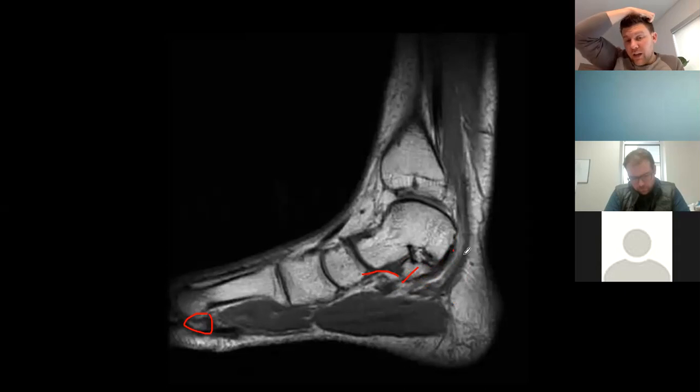Okay. So you're going to say that it's hyper or hypo intense compared to bone, right? So instead of just saying darker, compare it to something. You said it's almost isointense compared to a tendon, but it's not quite. It's a little bit brighter, right? So if you know the FHL is here, what also runs down here that isn't bone and it's not a tendon? It could be a ligament.